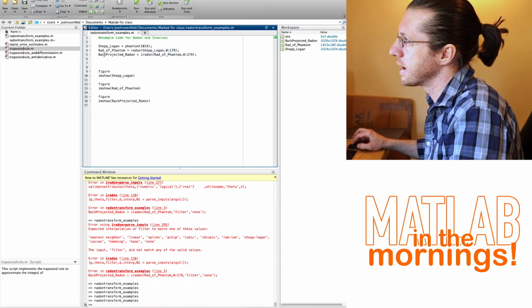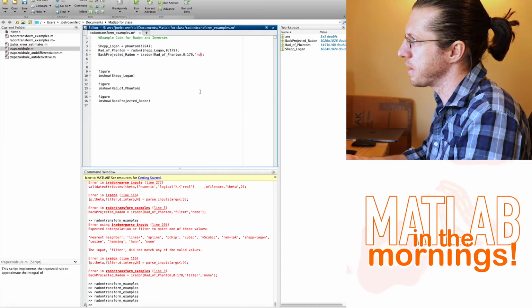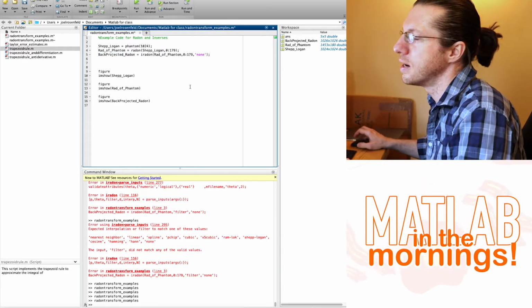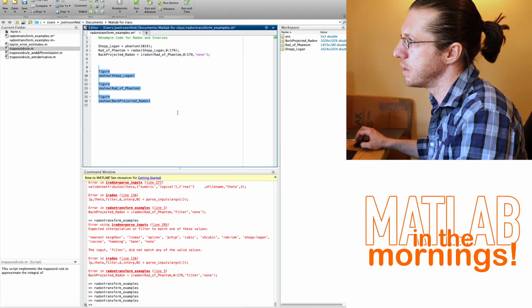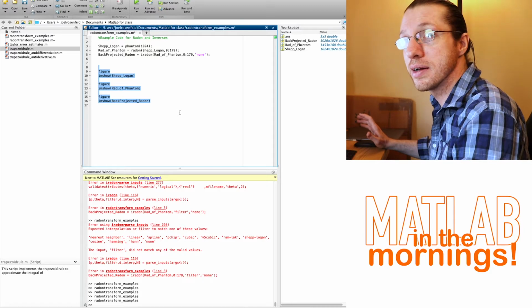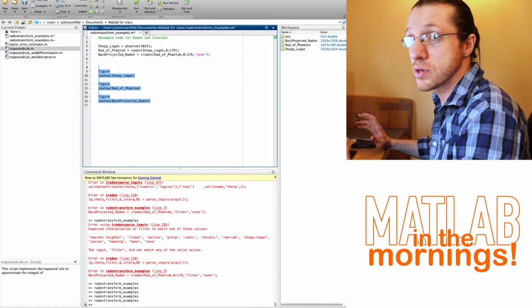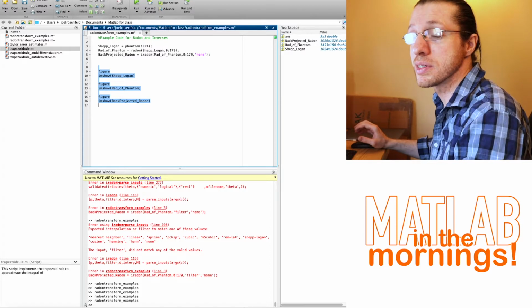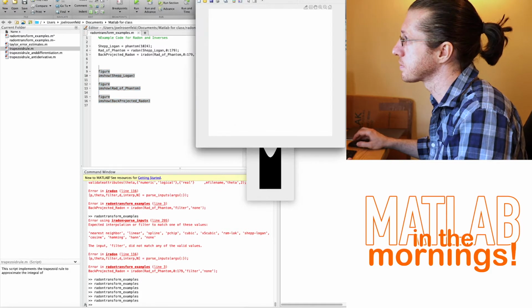Then I can go ahead and do a back projected Radon. First, let's take a look at what happens when you don't do filtered back projection, but just regular back projection. Here I have three different ways of showing it. Each of these ends up being a matrix, and I'm telling Matlab to treat these as images and just show me what you get. So let's push play.